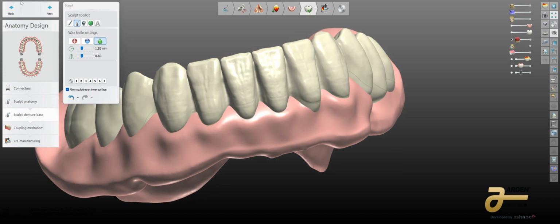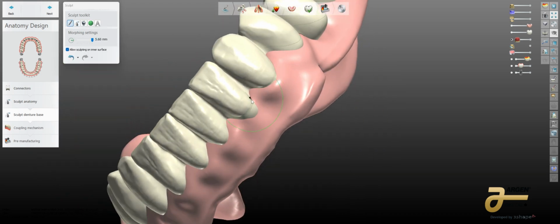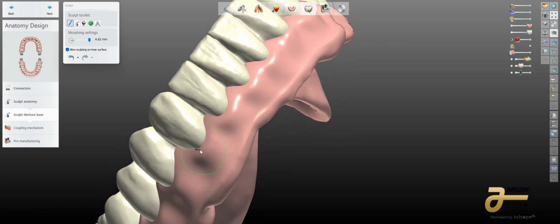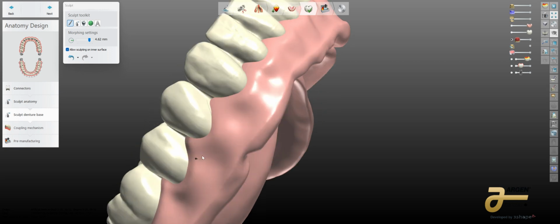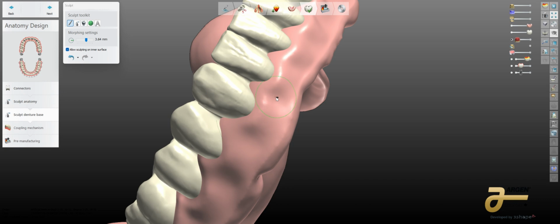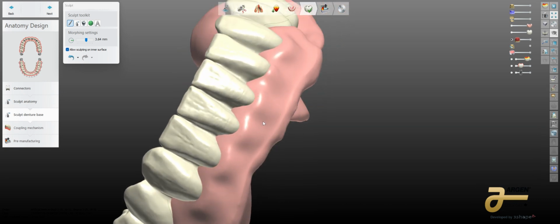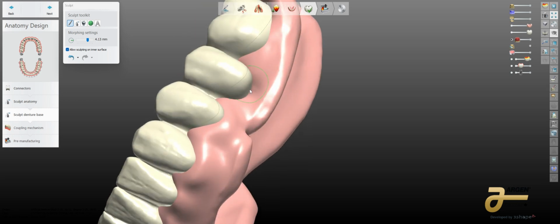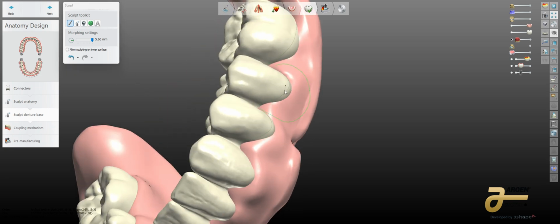All right. So now let's go ahead and finish this thing up. We're going to go ahead and just bump up the papilla and the free gingival margins just a little bit. But you see, I'm not reinventing and sculpting and sculpting and sculpting. All I'm doing is just highlighting the areas that I know are deficient and smoothing the areas that I think are too pronounced. You know, that's the easiest, simplest terms to really follow what I'm doing. And remember, don't screw this up like I just did again. Turn off that allow inner when you start to use this tool so you don't come up over the edge.